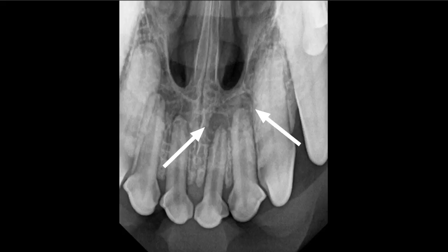And you look at that radiographically, and lo and behold, two of those have a very distinct lucency. All four of those central incisors have increase in the pulp cavity diameter compared to the pulp cavity diameter in those lateral incisors. So those are all dead. The lucency, again, same pathophysiology: tooth dies, necrotic pulp causes inflammation and subsequent bone destruction. So again, those are extractions.